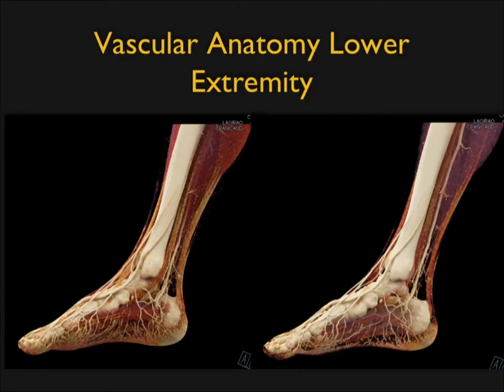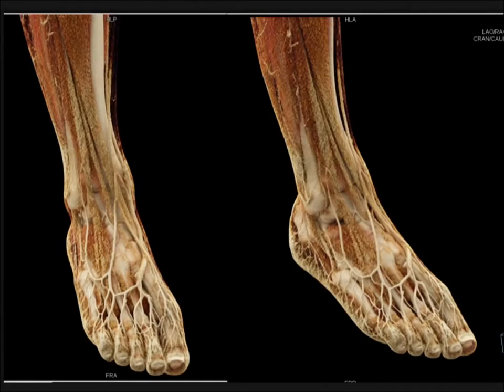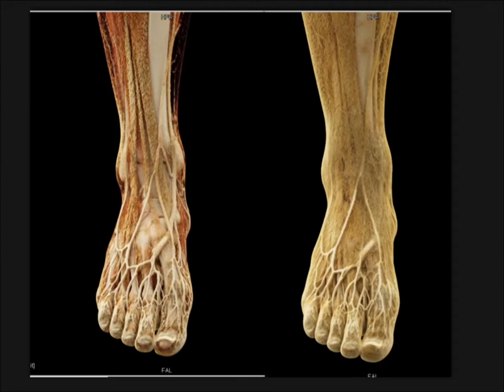Now with cinematic, Steve's going to speak about musculoskeletal, but let me just show you a little bit on the vascular end of the details to the foot, the trifurcation vessels, the muscle, the soft tissues, the arcades in the foot, everything beautifully, beautifully shown.